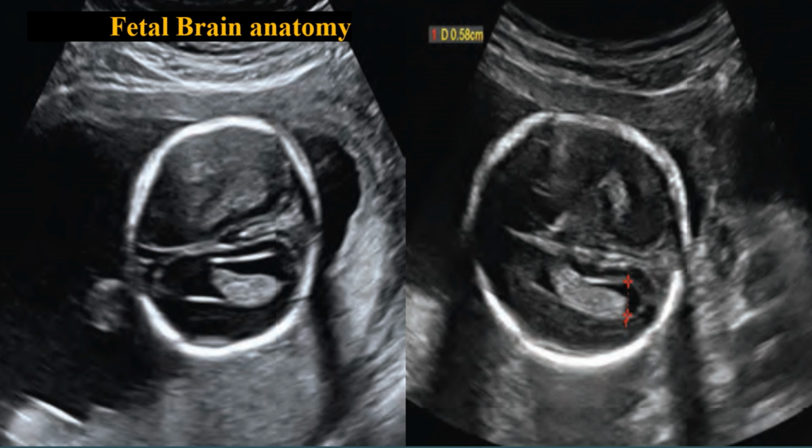And now here we can see the incomplete filling of the lateral ventricles, and here we can see the small amount of fluid between the medial wall of the lateral ventricles and the medial surface of the choroid plexus, and this is considered a normal variant. When the lateral ventricle is normal in size, the choroid plexus typically fills at least 60% of the width of the normal lateral ventricles.